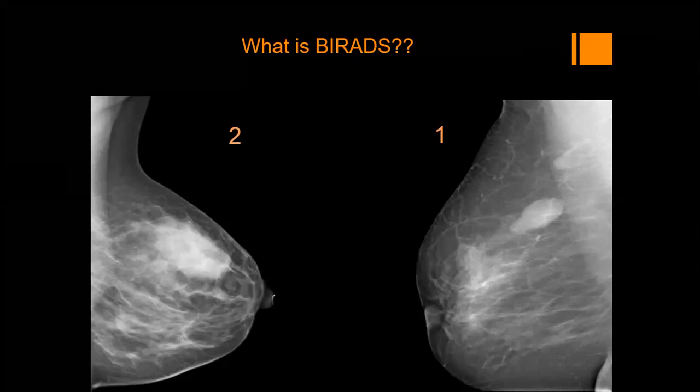What about the nipple? It seems there is nothing, no projections. There was nothing. It is not significant. It was not significant in my case.